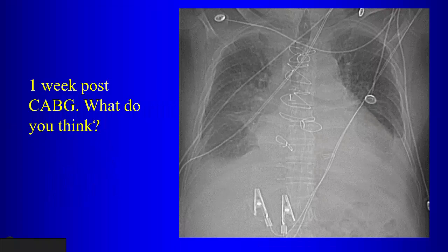Now, when you're reading chest radiographs, a lot of you will just say sternotomy wires. Say something about the wires. Don't just say sternotomy wires; say the sternotomy wires are intact. The way you dictate affects the way you think, right? So say sternotomy wires and then something about them. Are they intact? Look at them. Are they where you expect them to be? So what complication has this patient had then?